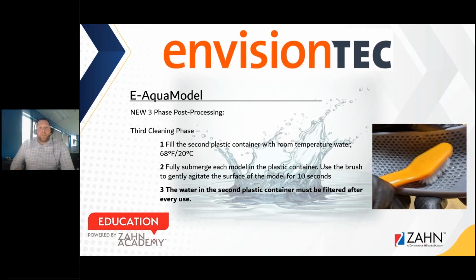So previously you would have to take the prints and let them sit in an IPA alcohol bath for about 20 minutes. After that, you'd have to do some light agitation just like we would with this one, but then you'd have to run it into a second IPA alcohol bath, which makes it a little bit longer process. So we have about 40 minutes as opposed to a 20-minute and some odd second cycle that we have here.